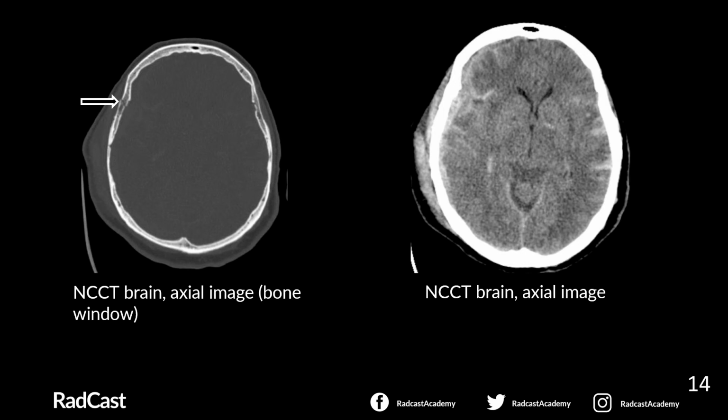This patient has a history of head injury. CT brain shows a right temporal fracture with subarachnoid hemorrhage, as acute blood appears white on CT.